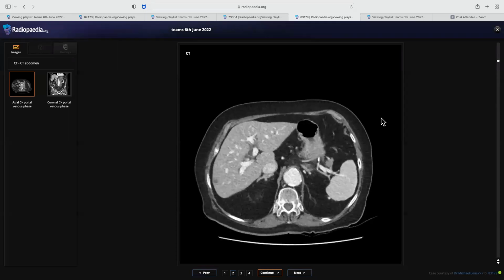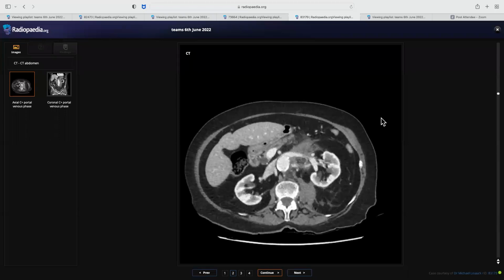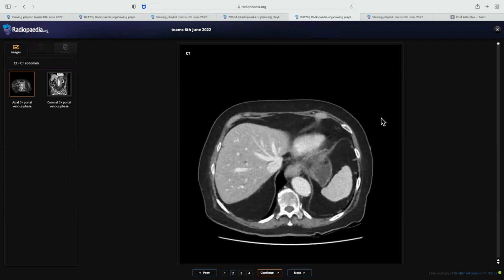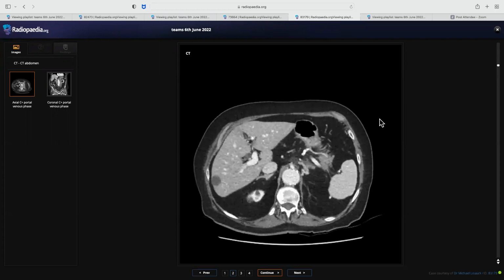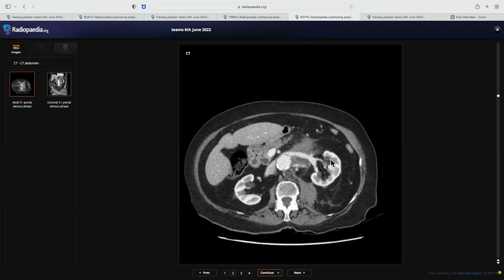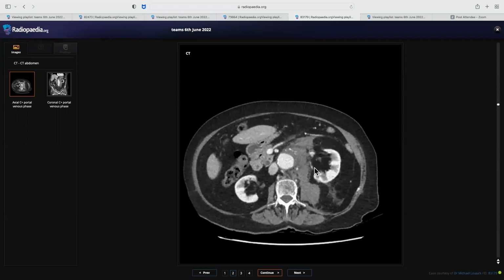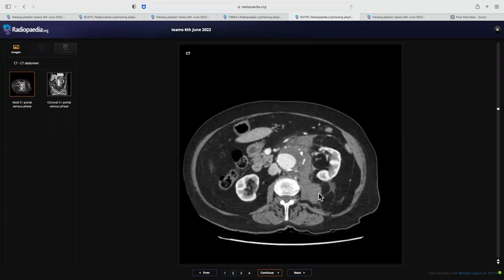So based on the radiograph, you told me you were suspecting aneurysmal dilatation with some leak that could have caused back pain. Yes. So you said you will look for rupture of the aneurysm. Yes, that's why we did the CT. There is some collection in the retroperitoneum. Can you identify any point of leak? And what is this collection? This is the area which is hyperdense, along the left psoas margin.